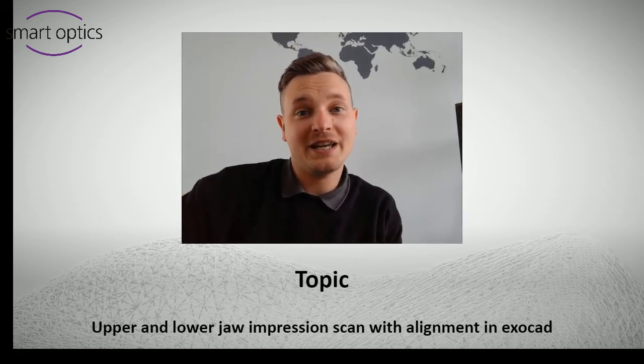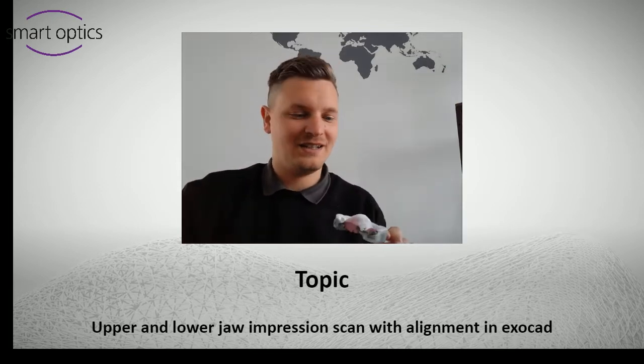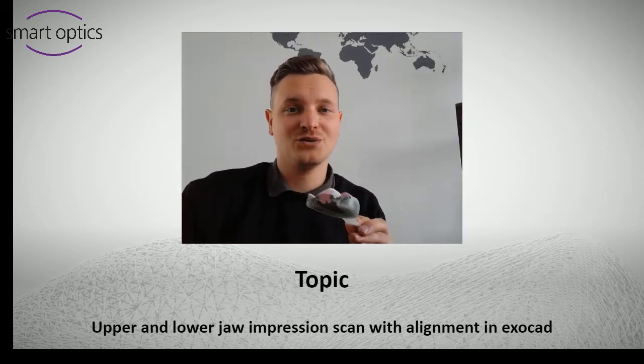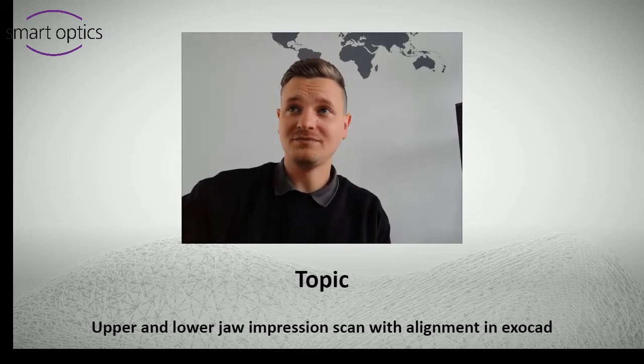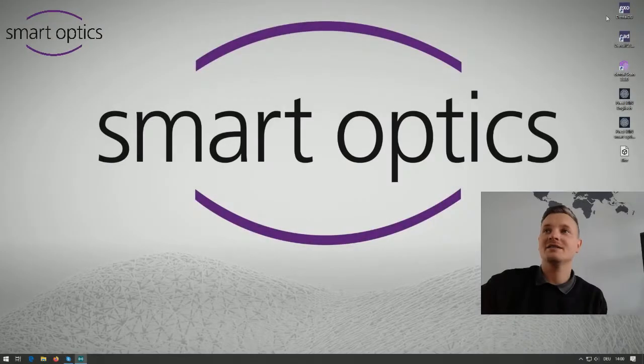My topic today is to talk about how to scan full impressions, upper and lower jaw, and how to do the alignment in exocad. Therefore, let's start the presentation and let's start the dental DB of exocad.